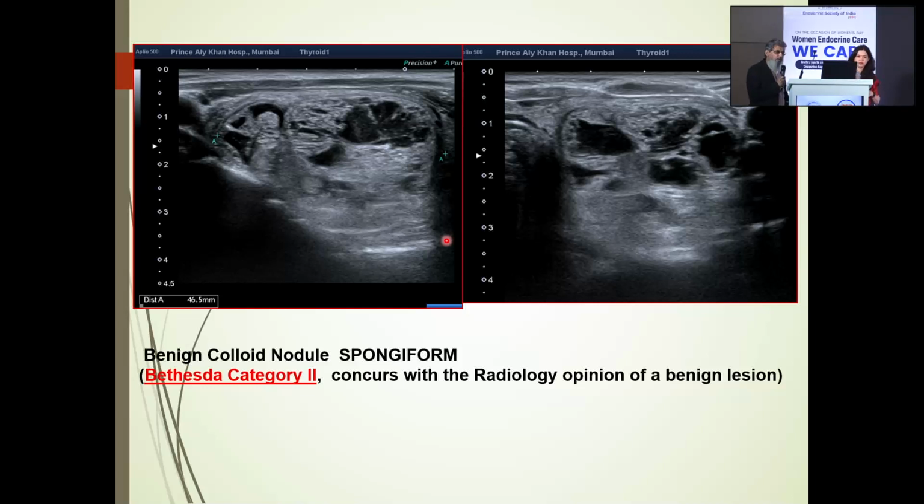The reason it is in vogue is to make clinicians understand, with the success of BIRADS, which is tremendous. TIRADS is now labeled as a very important tool by which we talk to each other without really talking on the phone. We just write it. So our job is to include descriptors. There are various descriptors which have been previously used in isolation, like perilesional halo, spongiform pattern, cystic pattern, and some other evaluations, and that could be done by giving the size. The size is most important, because we have to understand whether it is wider than tall or taller than wide.